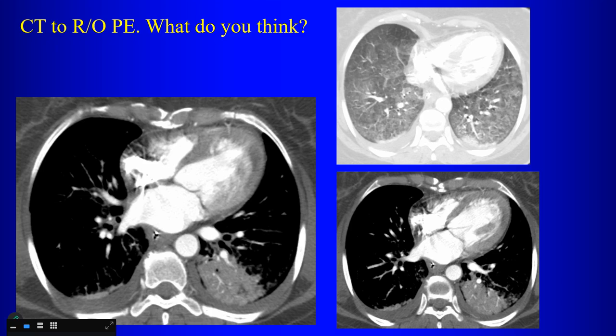Okay, so we think this is cardiogenic. So what makes you think it's cardiogenic? This is cardiomegaly. What part of the heart is enlarged? The left ventricle. So we think the left ventricle is enlarged. What about the left atrium? Yeah, the left atrium is also enlarged, okay? So, any idea why this patient might have cardiogenic pulmonary edema? Any ideas, any thoughts?